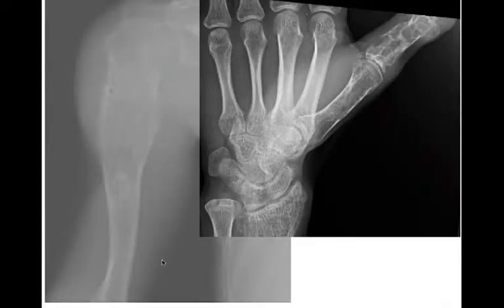Okay, so you can look at this case. So multiple lesions. So this is their hand. So you can see there's a geographic lytic lesion. It's a narrow zone of transition occupying the first proximal phalanx. Hard to see about the border, but maybe a sclerotic border. That's just the cortex. And another one in the proximal humerus. This whole proximal humerus looks very irregular, and there's this stippled chondroid matrix in here. So this was another multiple enchondromatosis. So a big enchondroma in the humerus and multiple enchondromas in the hand.